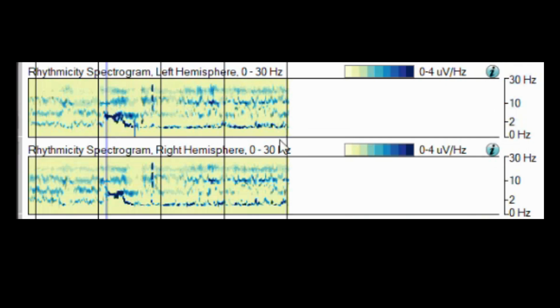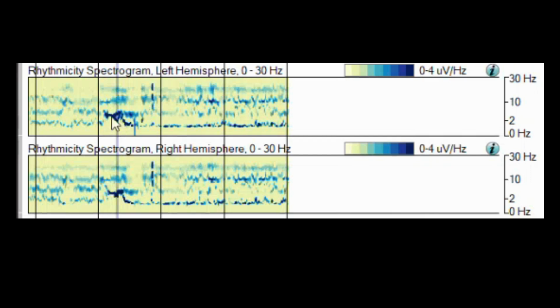And then it starts to slope down, and it actually splits. There's some activity that speeds up, which is okay. There's different frequency bands or layers a lot of times with EEG, and then it also slopes down.